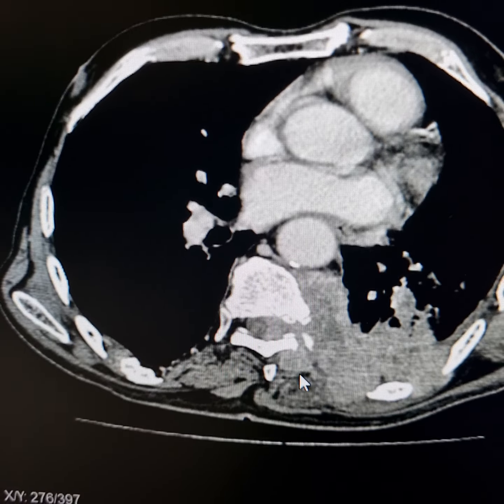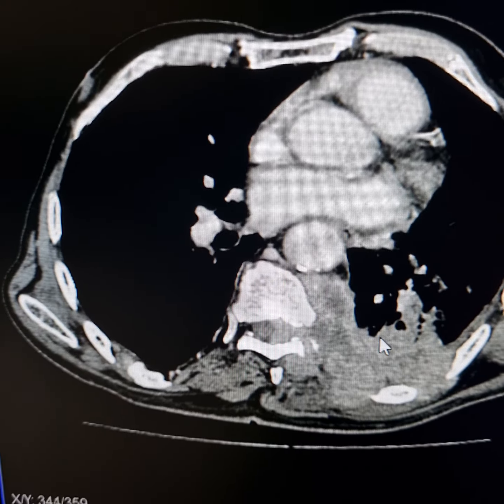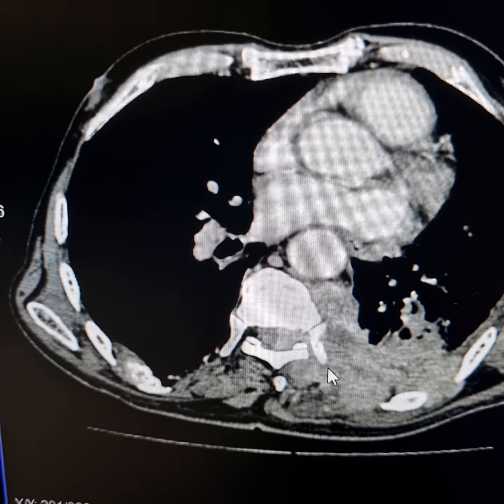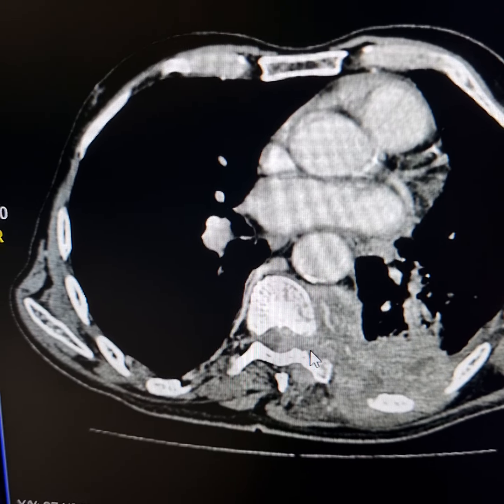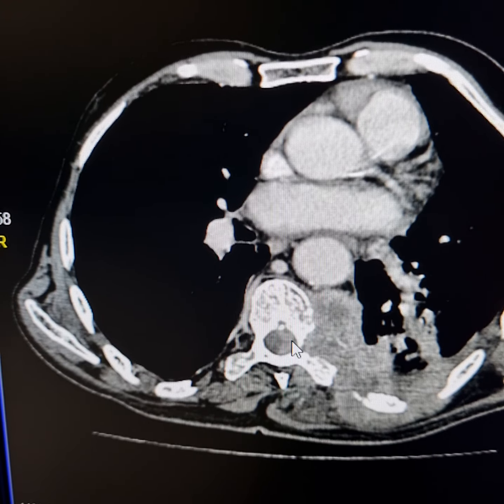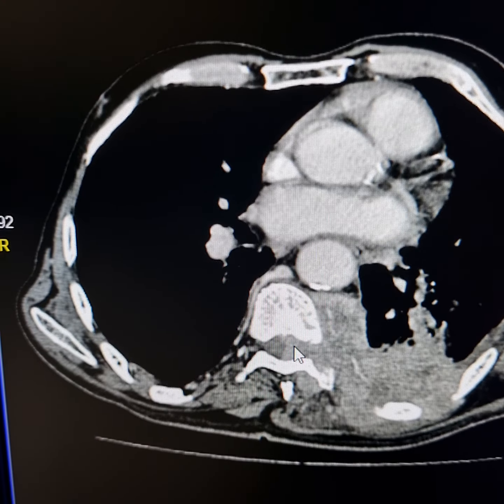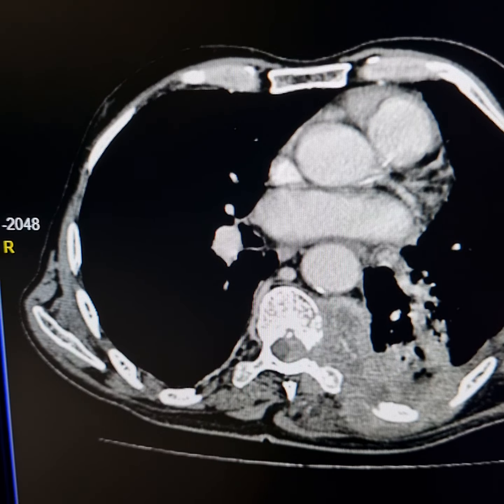Please observe that the left erector spinae muscle is involved. The mass shows intraspinal extension through the respective intervertebral foramina. This one here, it has compressed the spinal cord, pushing it across the midline onto the right side.